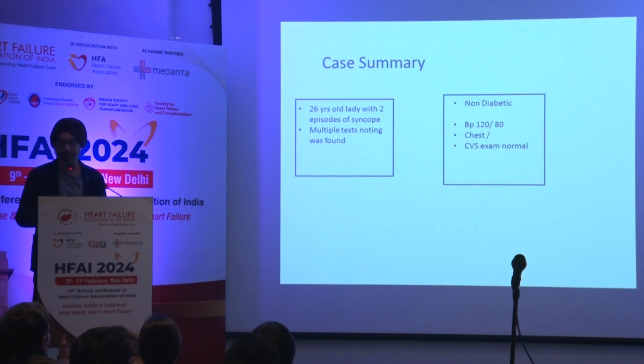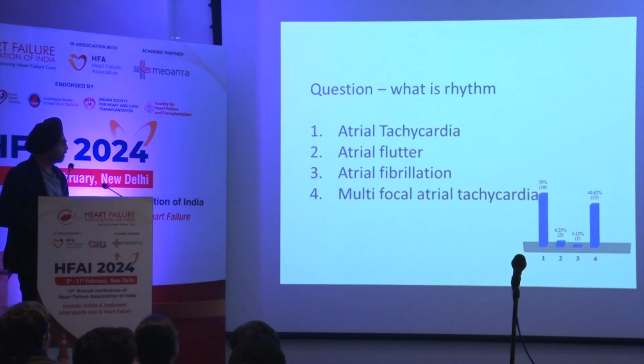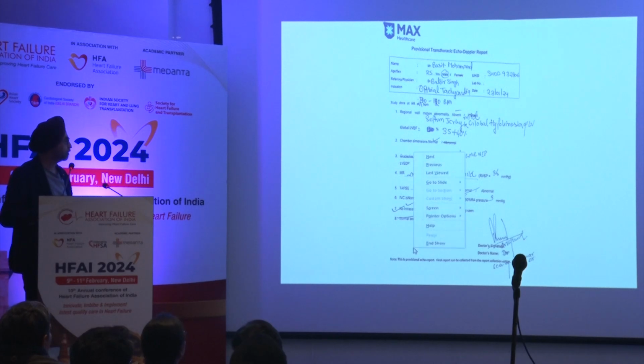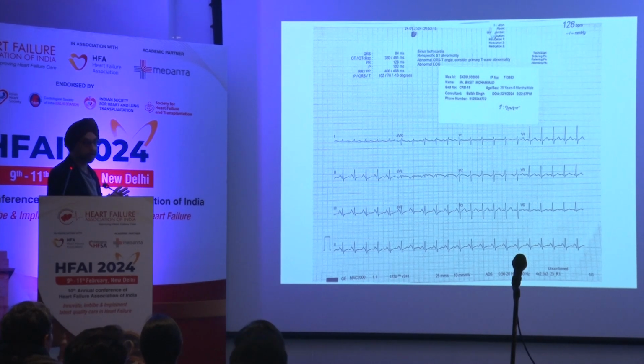So this is a tachycardiomyopathy. So it becomes so much important for you. Can you go back, please? So I would tell you many cases. Okay, so many patients in the past have been treated in heart failure clinics, this being labeled as sinus tachycardia, and they have continued to deteriorate in the ejection fraction and never improved.